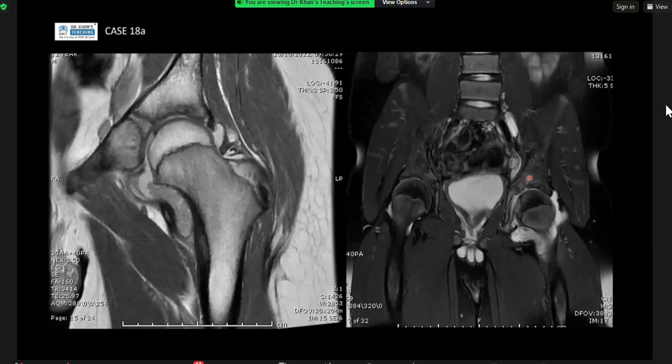Now, a small thing: we do MRI of the hip, we also look for other features. In this T2, there's probably irregularity of the chondral surface. It's probably just an incidental osteochondral lesion that's not associated with the underlying process.